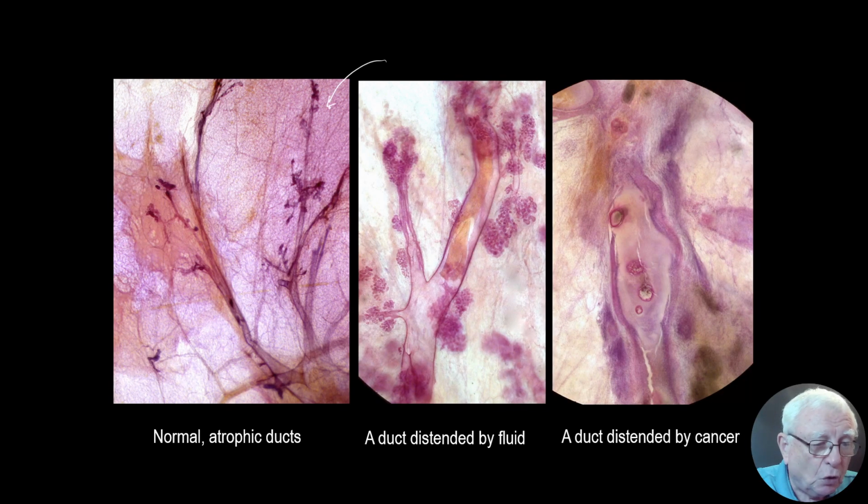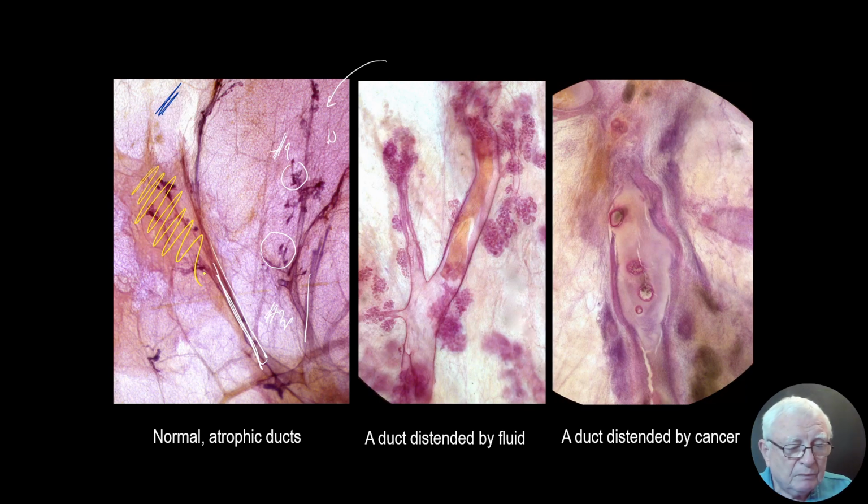Let me show you the normal, pleated, resting duct. Always look for 4 basic building blocks. This is a sleeping, atrophic TDLU. That's basic building block 1. And the duct, skinny, atrophic, that's number 2. The white is the fat, and the yellow is the fibrosis. This is normal. This is hyperplastic breast change. It has a lot of TDLUs. They were producing the fluid. So this is just ductectasia, normal.